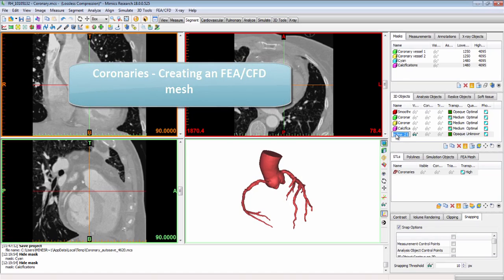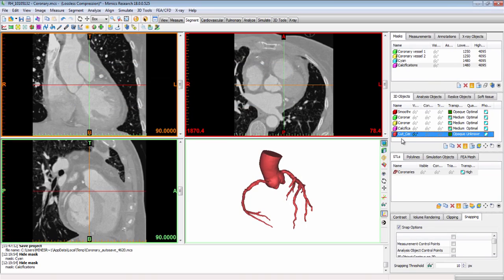3D models produced in the Mimics Innovation Suite are often used in finite element analysis and computational fluid dynamics applications for research studies. The FEA module in 3Matic can be used to prepare and pre-process the surface and volume geometry of these 3D models in order to prepare them to be used in many solver packages like Fluent, ANSYS, Abaqus, among others. In this exercise, an aorta coronaries model is prepared with a surface and volume meshing to be processed for use in the ANSYS software.